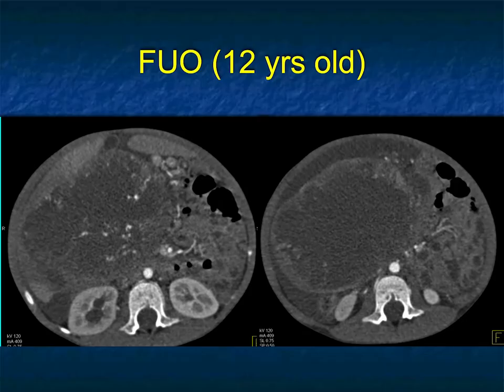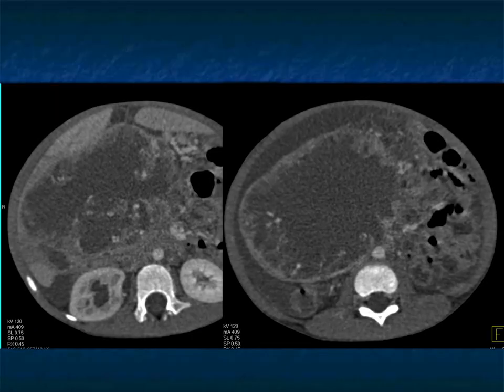What about this case? This was a younger patient, 12 years old, coming off the liver, a large cystic lesion, some increased vascularity, really necrotic. I guess I could think about a cyst adenocarcinoma, though that doesn't occur in 12-year-olds. We mentioned it's age 30 to 50, but occasionally you could be fooled.